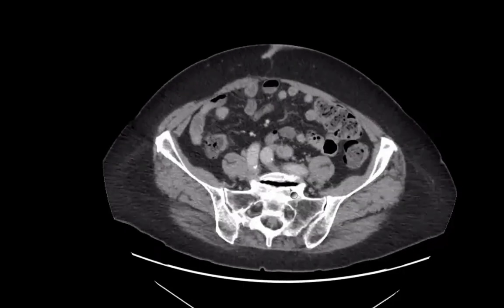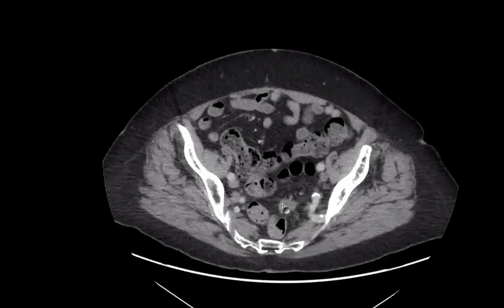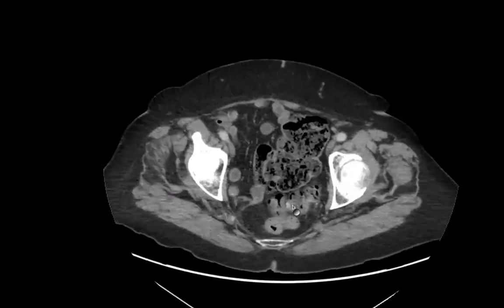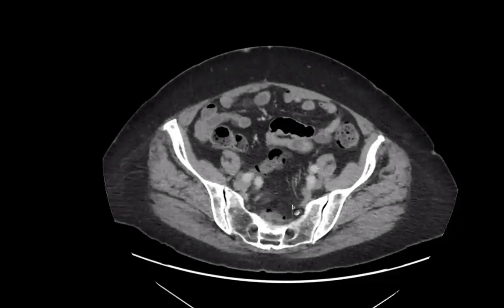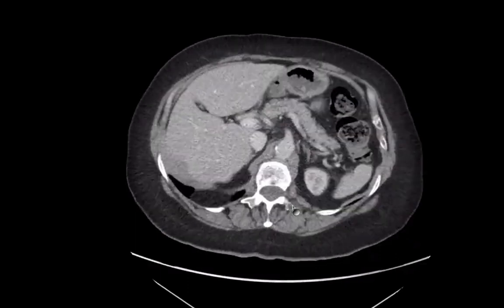So this is significant pathology, and this is now missed. But now you know this, and for next time you wouldn't miss something like this. You need to look at the mesentery for not only mesenteric stranding, but for mesenteric deposits, because these are more important. Because stranding can be inflammation or infection, deposits means cancer, and what you don't want to miss in the exam or in your life is cancer.